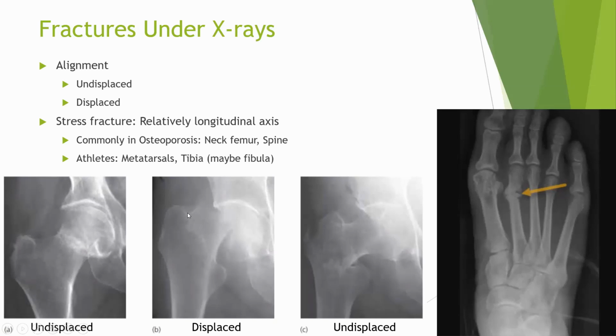How do you know it is superior? Look at this neck of femur line. It is way higher than that of the acetabular line. Way higher than that of the acetabular line. How do I know it is posteriorly rotated? Here, I am hardly able to see the greater trochanter properly.